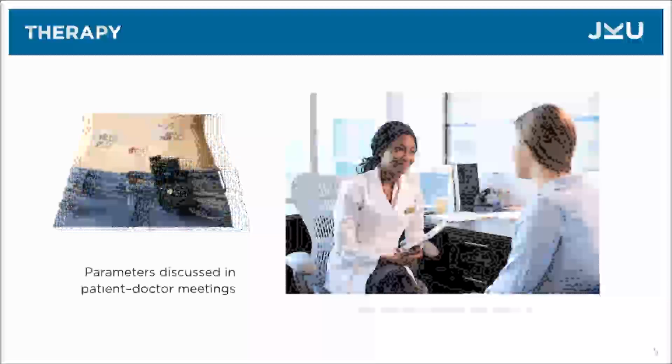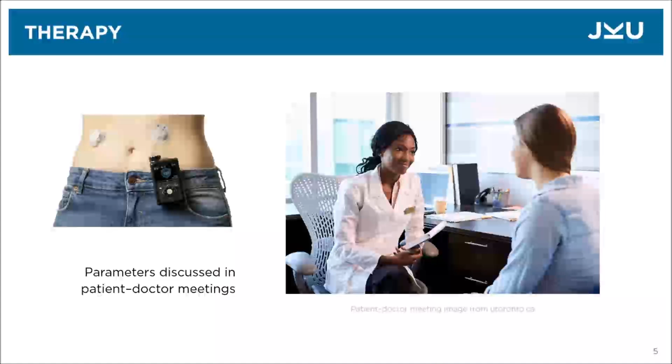An appropriate adjustment of therapy parameters requires a thorough analysis of past situations, which is usually done in regular time intervals with consultation of a diabetologist. We developed Marjorie to support doctors and patients in this joint data analysis.